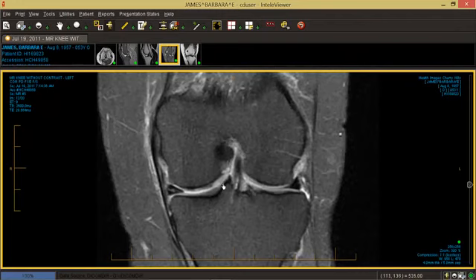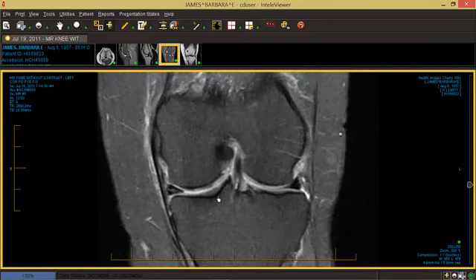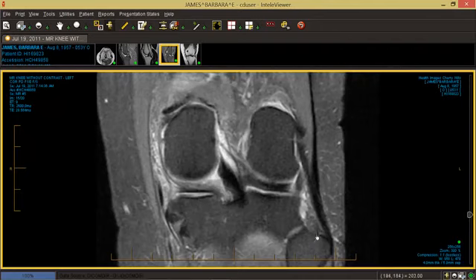You can also see that this gray cartilage layer here looks a little ratty, meaning it isn't uniform in how gray it is, which indicates some problems in the cartilage. In the middle here, you're seeing the ACL ligament as I scroll through these. Out here, the fibula, and that's how you know it's the lateral or the outside.